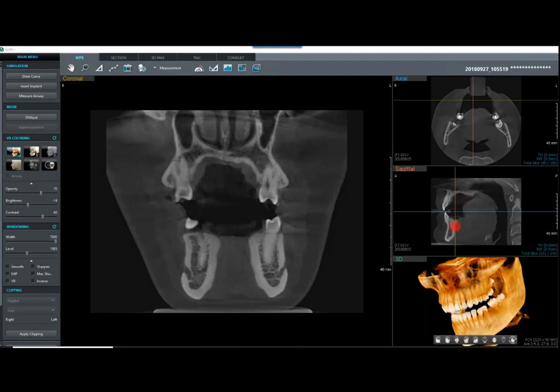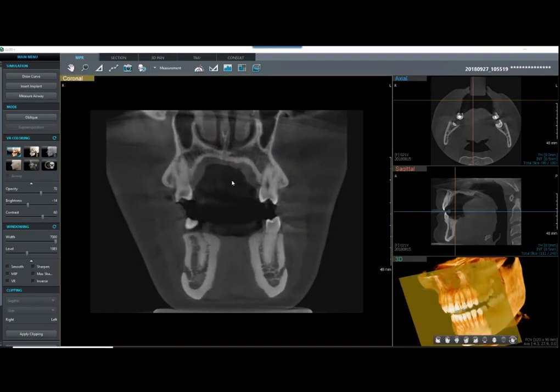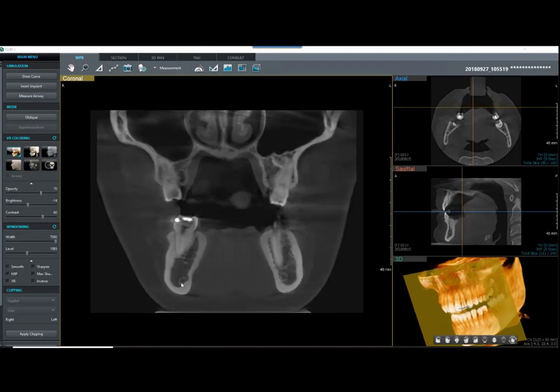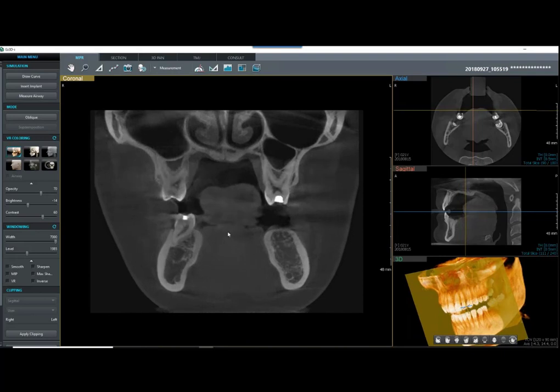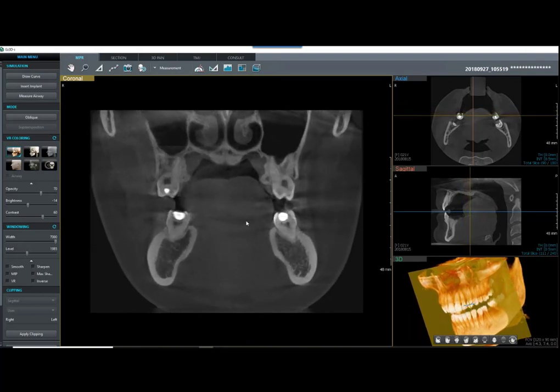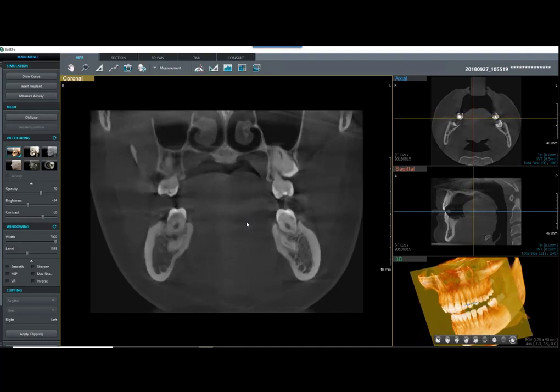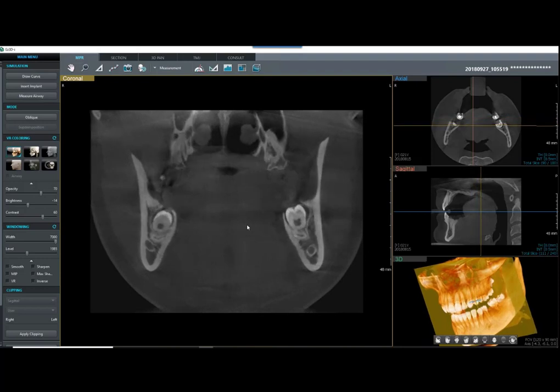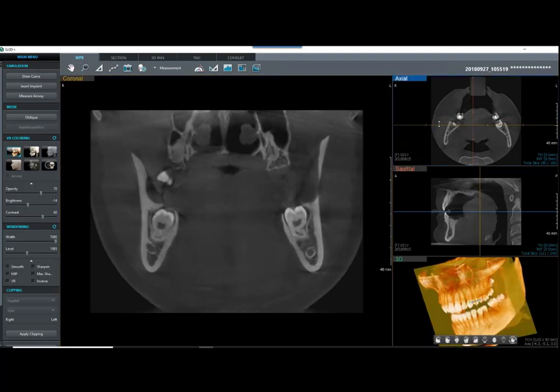And I can see my yellow slice here and here that we're looking from an AP view there. Start to see our maxillary sinus through there, our nasal concha. As we scroll back, I'm looking at following my nerve all the way into the ramus. We can see our hard palate here. All right, and we should be getting back pretty far. And what I'm doing is I'm looking over here. It looks like we're right at our third molars, or right near our third molars.